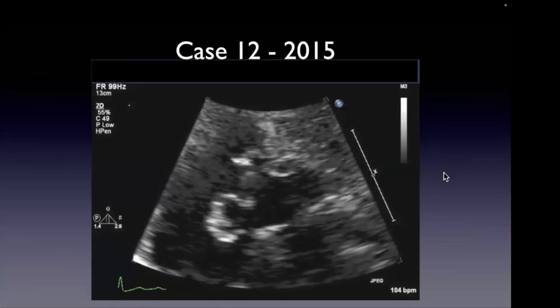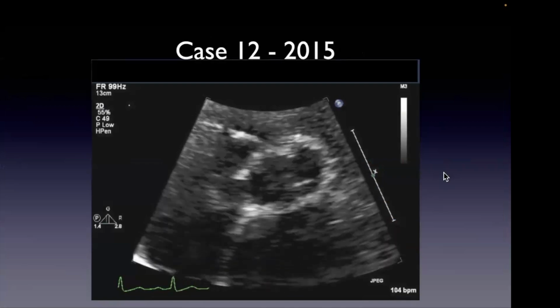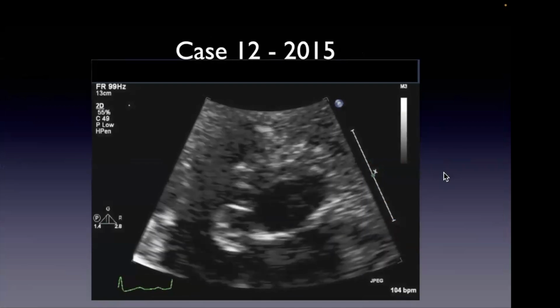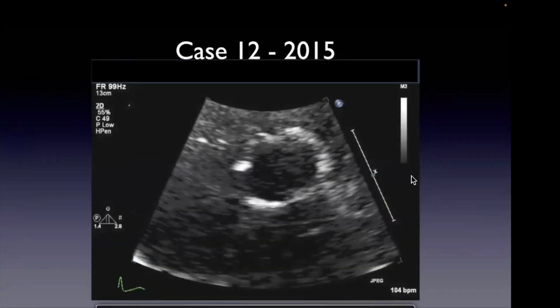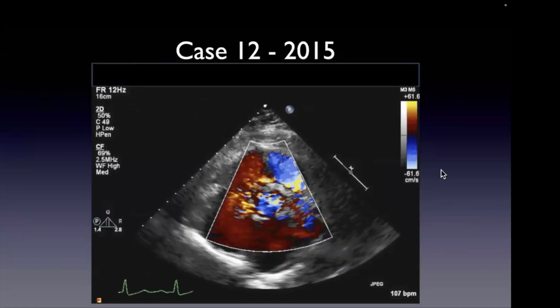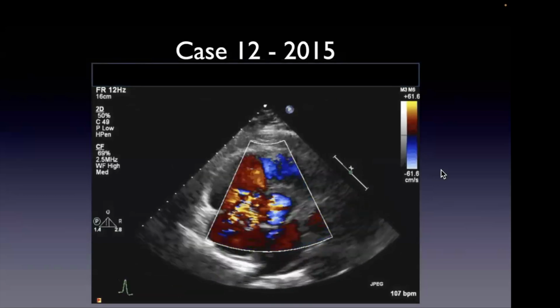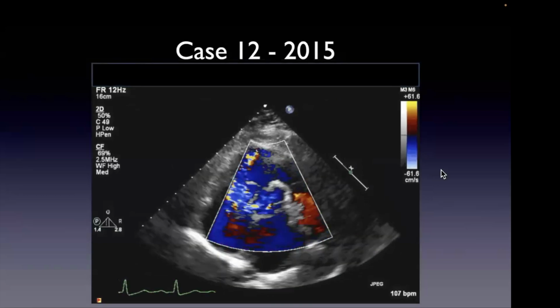It's late 2015. So you can see the echogenicity is gone. Maybe a little bit of residual over here. So the flow's changed. She presented in heart failure.